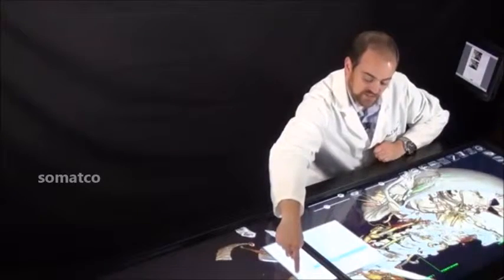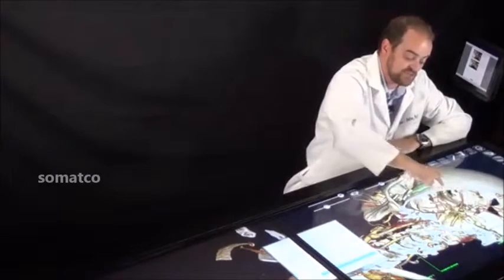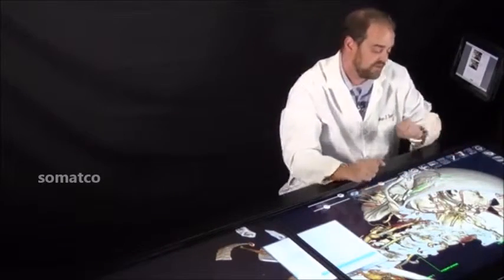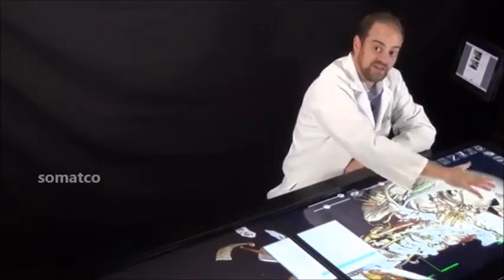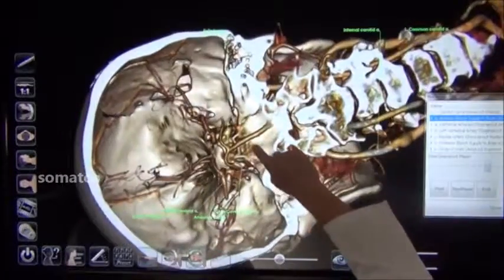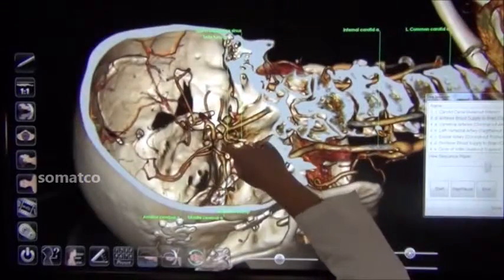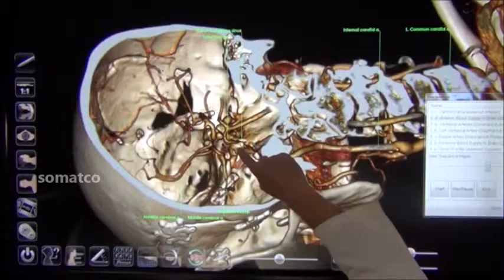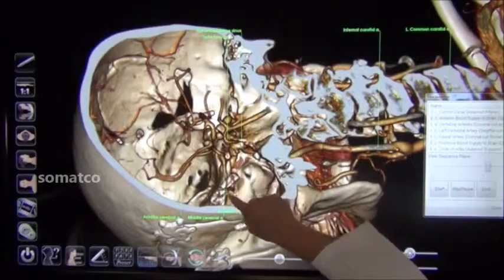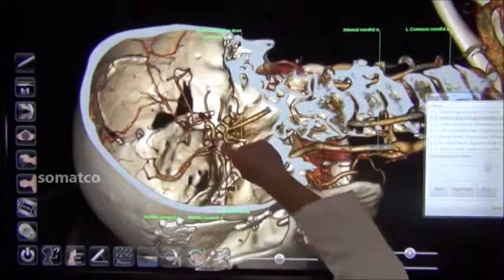We will then continue with the discussion that the anterior blood supply to the brain is actually provided by the internal carotid artery. This is a coronal plane as seen posteriorly to allow us visualization of the carotid arteries on either side of sella turcica in the cavernous sinus. The carotid artery will curl and then give off the middle and anterior cerebral arteries.